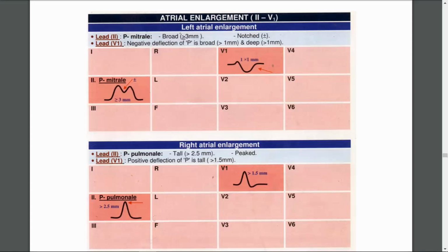We see if there is a P wave, and whether these P waves are all the same shape or not, and if they are the same shape, whether it is sinus in shape and direction. If there is no P, it is junctional or AF. If it's regular, so junctional. If irregular, so AF. And if it's wide and bizarre in shape and the T is in the opposite direction of the QRS, so it is ventricular.